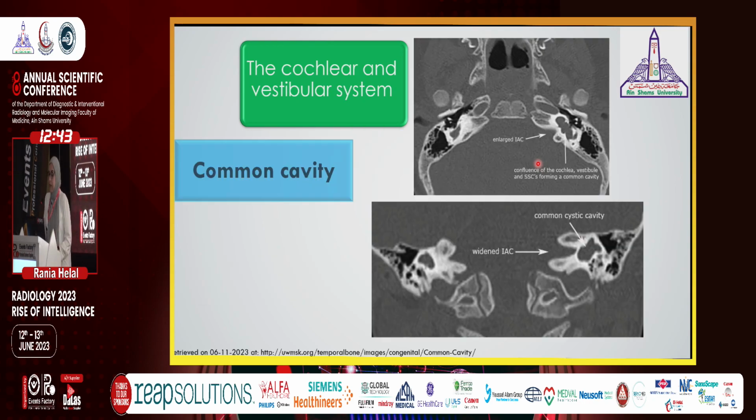Common cavity. In this deformity, the cochlea and the vestibule are merged together, forming one cavity with no internal structure. As we can see here, the cochlea and vestibule form one large cavity. And there are dysplastic semicircular canals, superior and lateral.